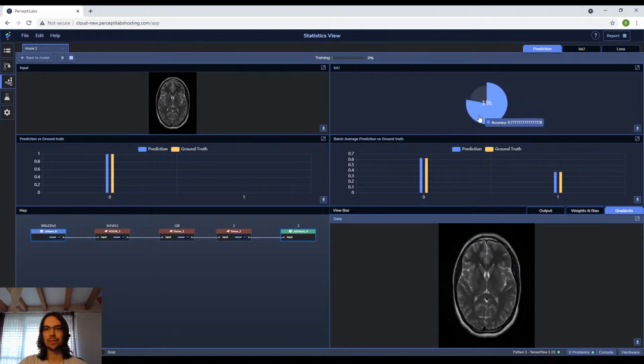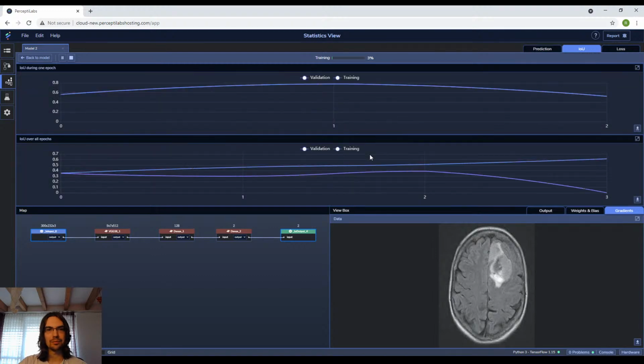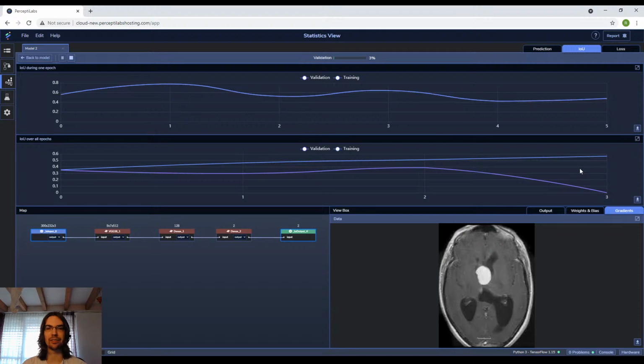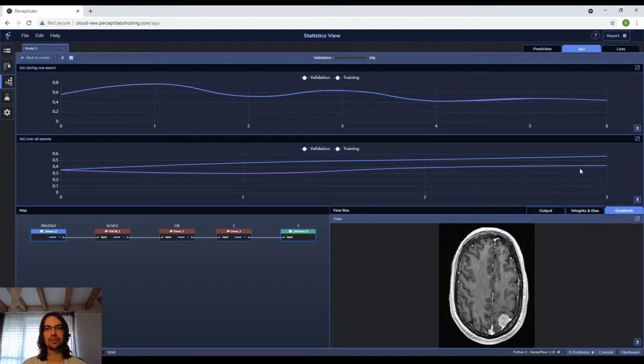Well, we are getting pretty decent accuracy, 77% or 50 in some cases. It's starting to increase over that 50% mark, which would be if you just took an image and randomly selected it. Since there are two different classes, it would be 50%, essentially as a coin flip. So that's more or less where the model starts off.